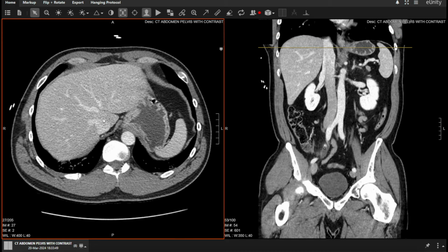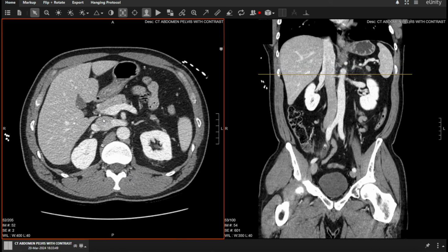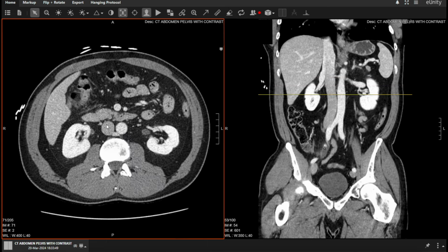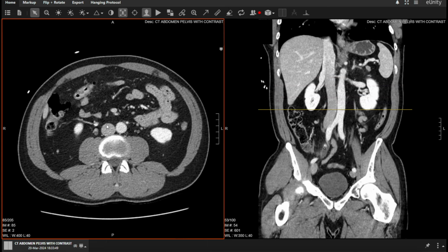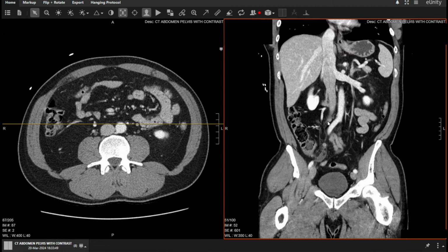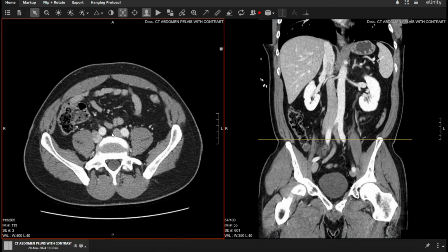We'll go back a little farther. Come down a little lower, and we'll see these large veins from the kidneys, the left renal vein, the right renal vein. Remember that the IVC is to the patient's right. That means that that left renal vein here has to be much longer and cross over midline to get to the kidney. And just like the aorta, the vena cava splits and follows the same type of path via the iliacs and femoral vessels.